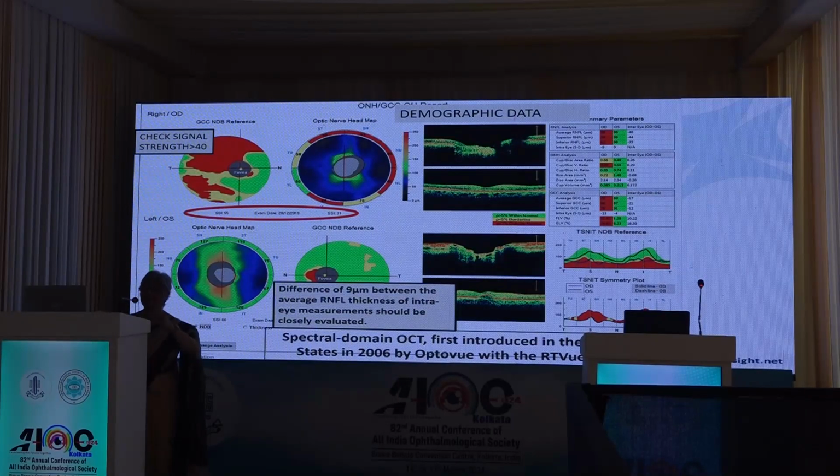You have done a clinical examination. You've come to know the size of your optic disc. Please have a look. Is your optic disc that size? Is it large? Is it small? Have a look at the cup. Is the cup small or big as you have determined it? It'll tell you objectively what the data over there is.